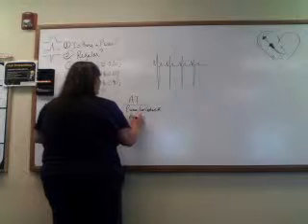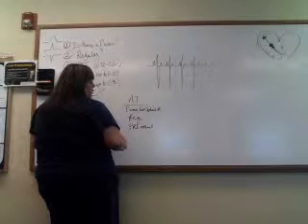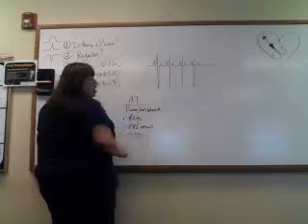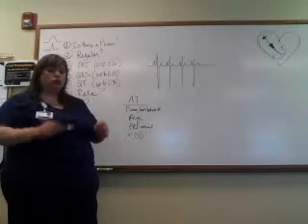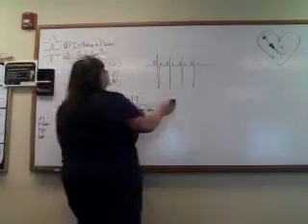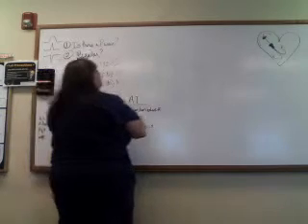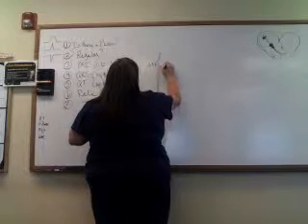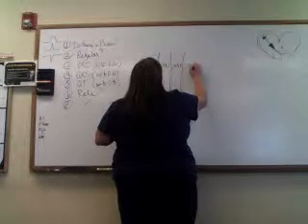It is regular. The PRI is normal, so it falls into the 0.12 to 0.20, and this one usually is at least about 150 on our rate. So you know it's a fast rhythm, and it's usually something that needs to be treated, okay? So also, if you have something else going on, what if you had more P waves for each QRS?